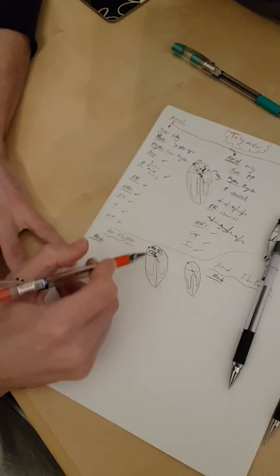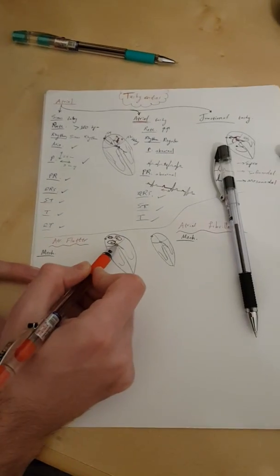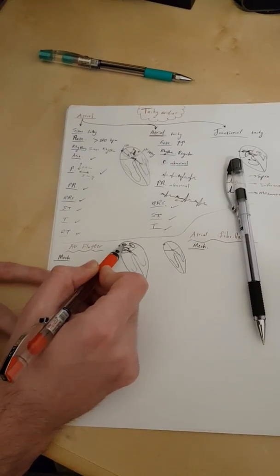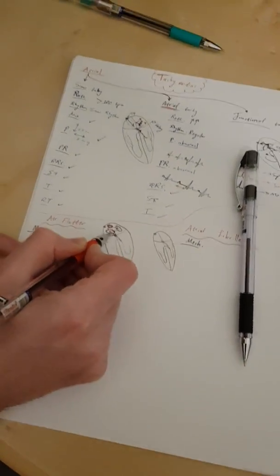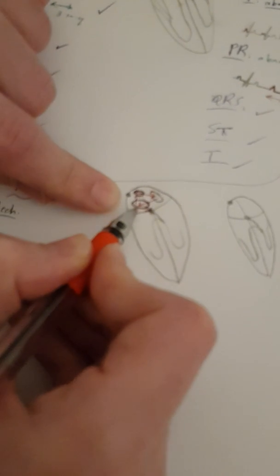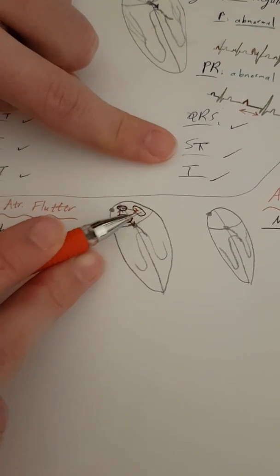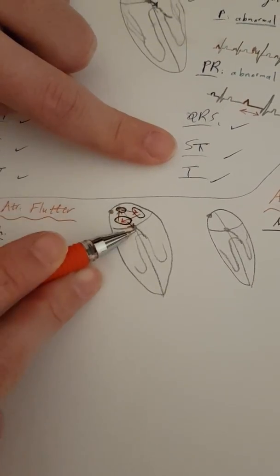So what I'm saying is the AV node, thus the QRSs that we're going to get later, are always coming from the same circuit. That depolarizes at the same interval after every cycle. And by the way, from this it will go back up. So it will keep going 1, 2, 3, and then 1. While 1 is happening, you see here there are 2 arrows up and down. As it's happening down, it will happen up again. So we get 1, 2, 3, QRS, 2, 3, QRS, 2, 3, because this one will be within the QRS.